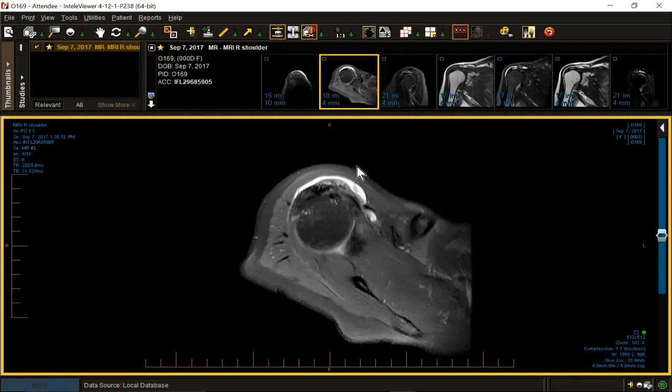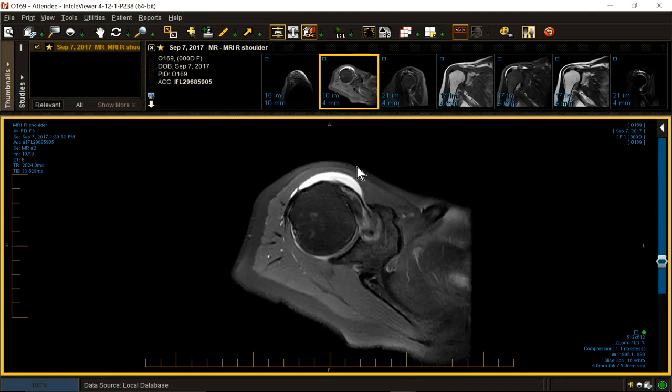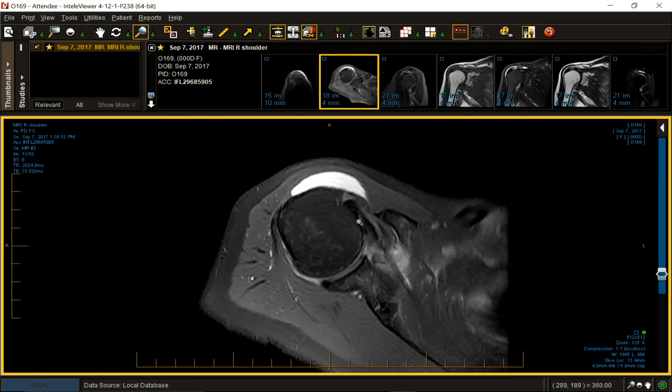While you're looking, I'll go back to my standard axial search. They've given me a proton density, relatively low in-plane resolution image. The field of view wasn't very small. Through plane resolution, 4 millimeters, skip 1, mediocre.